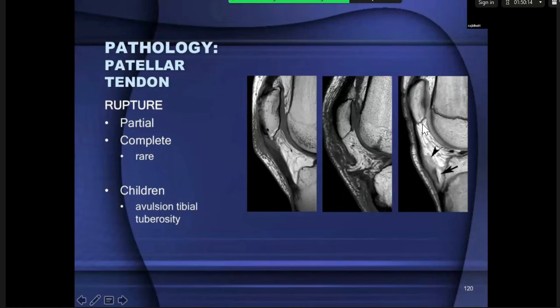In terms of trauma, I've seen this quite commonly in footballers, both professional, semi-professional, and amateur athletes. You get excessive edema and swelling of the inferior half of the patella. Notice that this is significantly greater than the initial example of magic angle artifact that I showed you. This is significant trauma, with lots of associated soft tissue swelling present.